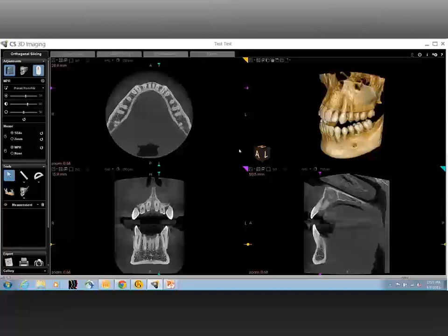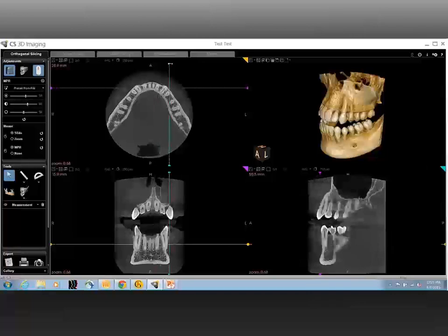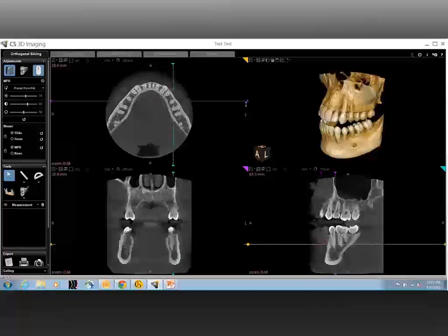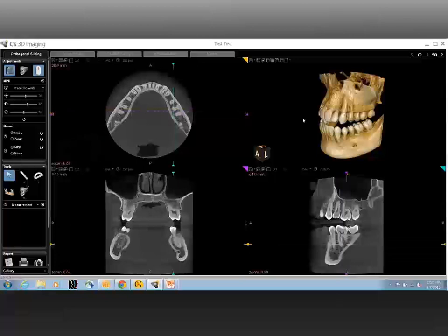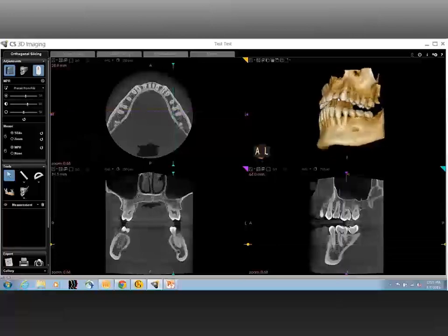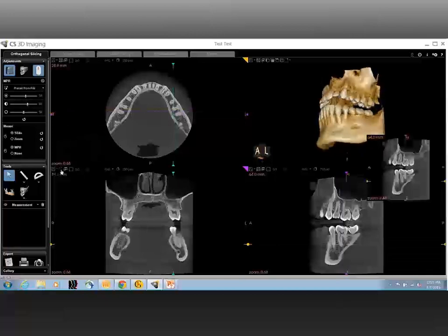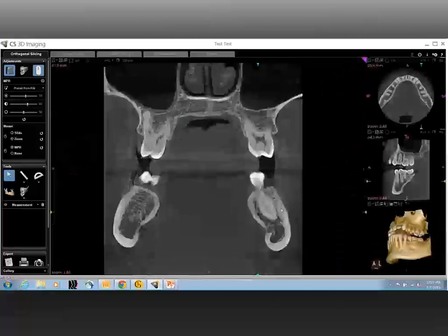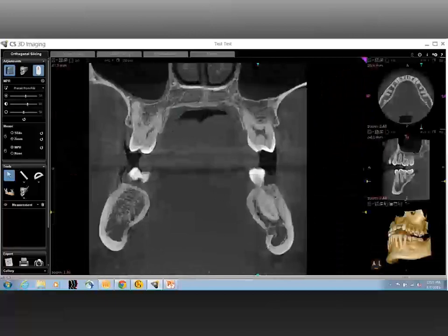Jordan, there are, of course, many important structures, but for the sake of a quick Q&A session, I would limit or list out a few structures that are absolutely important while reviewing a scan. In the mandible, or just as in any bone, a few things to be noted. Number one is the cortical bone. The cortical bone by itself acts as the margin of the mandible. Now, if you notice, as the cursor indicates, the cortical bone is thick, pretty prominent, and forms the margin of the mandible.